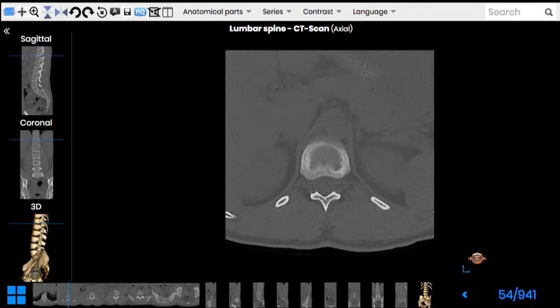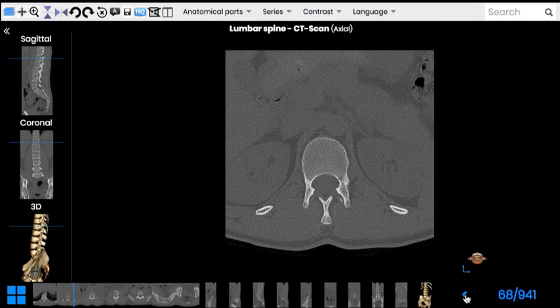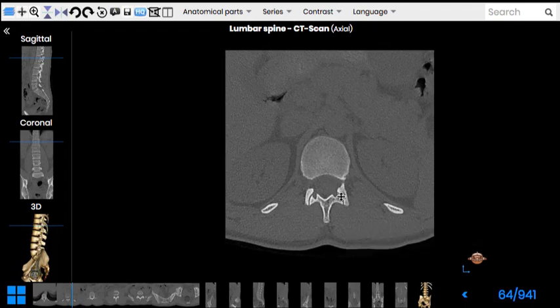And I see the dramatic change in direction of zygapophyseal joints. Now they are more vertical. That reduces their mobility but increases the stability, and we need stability in this region because the weight of our body eventually comes to the lumbar vertebra.